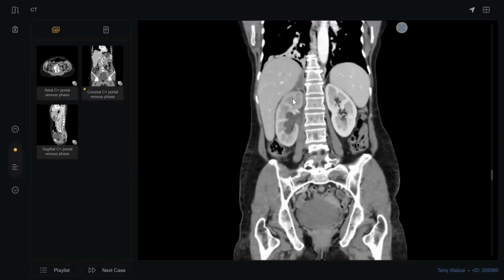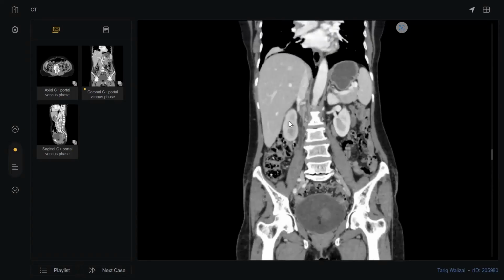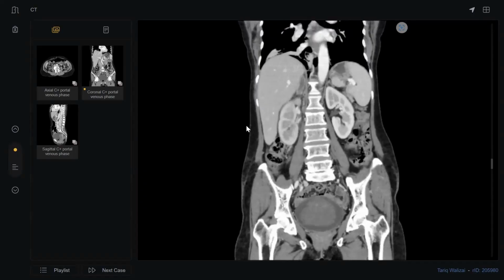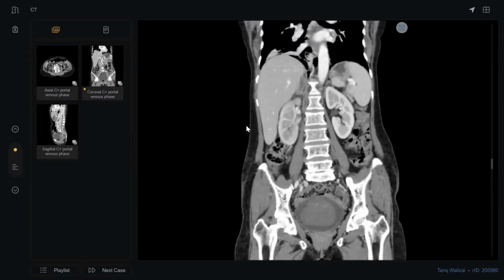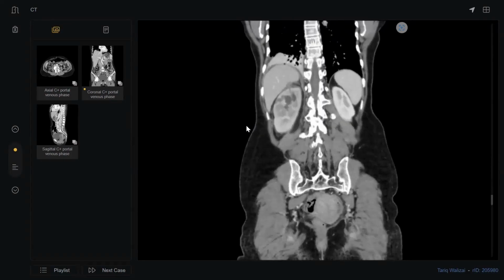And you forget to tell me about hydronephrosis. What is the cause of hydronephrosis here, doctor? Could you tell me? The thrombus within the excretory system, the collecting system in the ureter, will cause this one. Thrombus or hematoma? Big difference. Hematoma, basically. Hematoma. Yes. Okay.